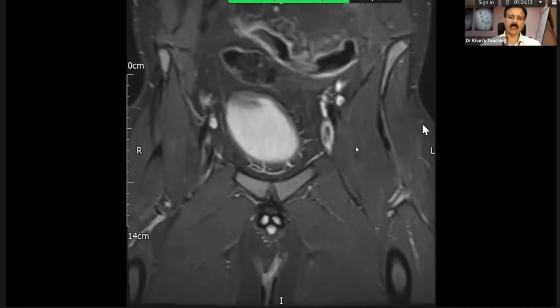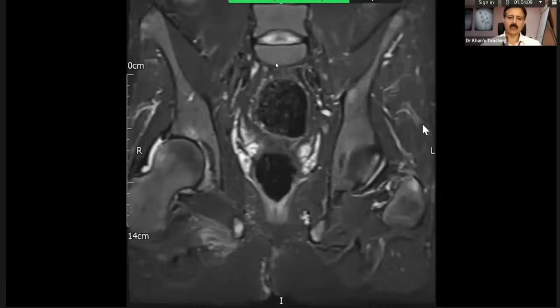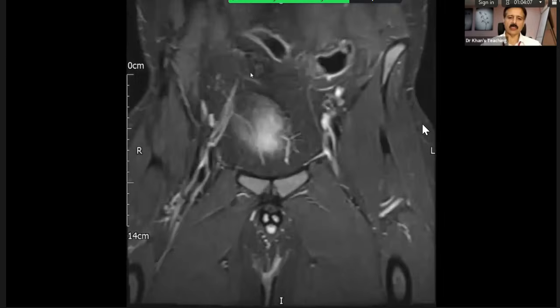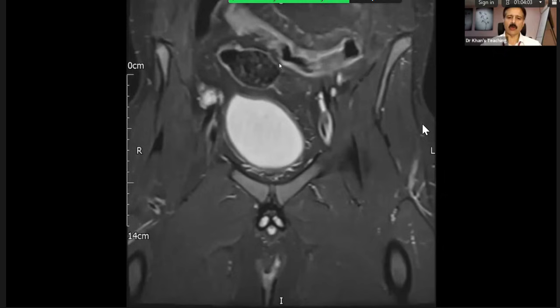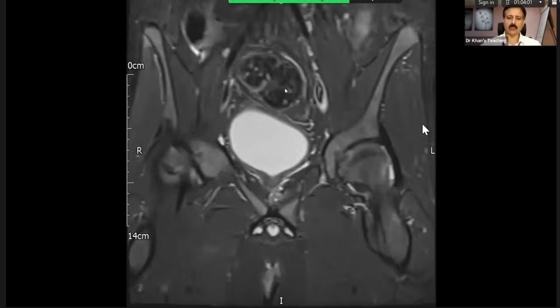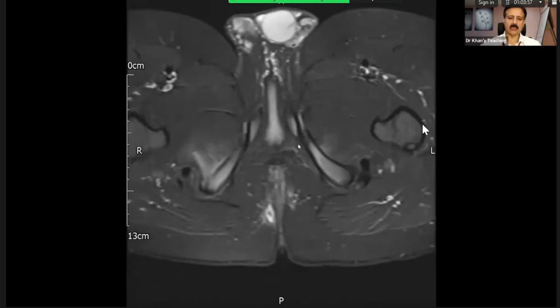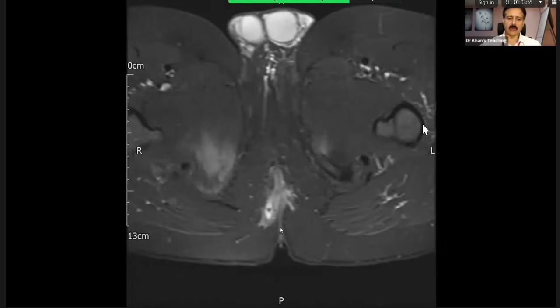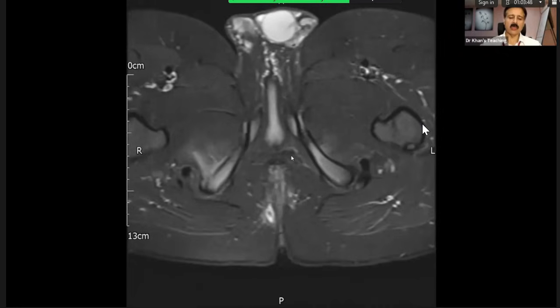So even here, you can see this bowel to be inflamed. So if you see, this is the sigmoid colon. Of course, it's very difficult to pinpoint what it is. Actually, it was the small bowel. It was not in continuity with the sigmoid. So here you can see it goes, and then at 7 o'clock it communicates here. Sorry, 6 o'clock.